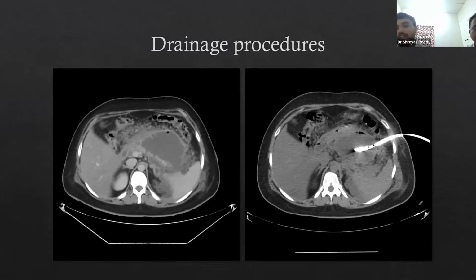Maybe possible vascular complication or formation of a pseudoaneurysm. Yes. Which artery is the one that most commonly gets affected in cases of pancreatitis? Most commonly, it will be the gastroduodenal artery. Yes. Sometimes even the splenic artery can also be involved. Excellent. So these are the two arteries, and these are the areas where you actually look for active contrast extravasation.